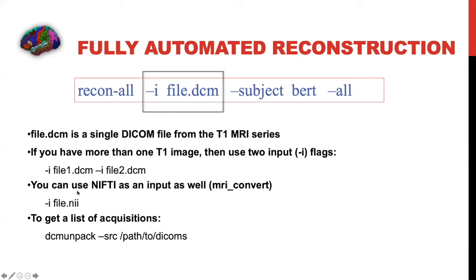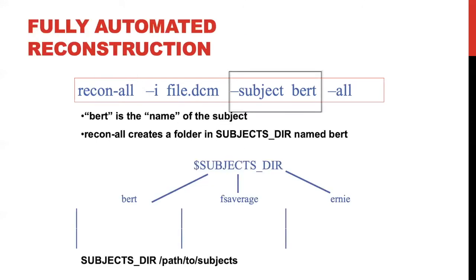And then you can also run this DICOM unpack command, and that will give you a list of the different acquisitions that you are inputting into FreeSurfer. And so you also want to give your subject a name.